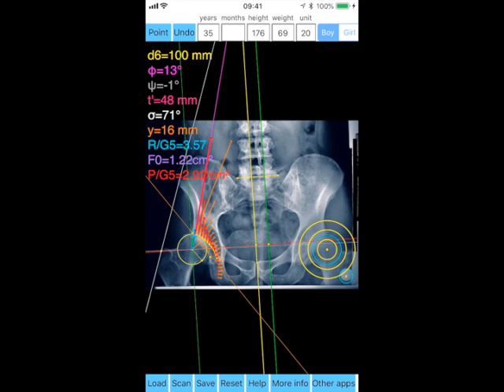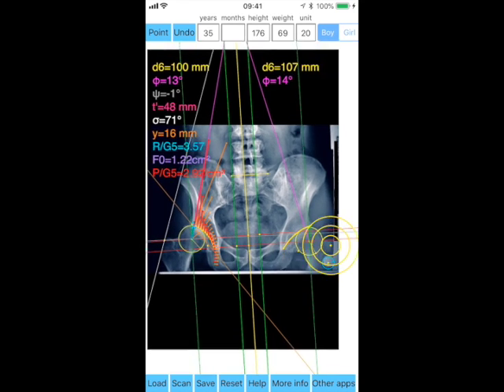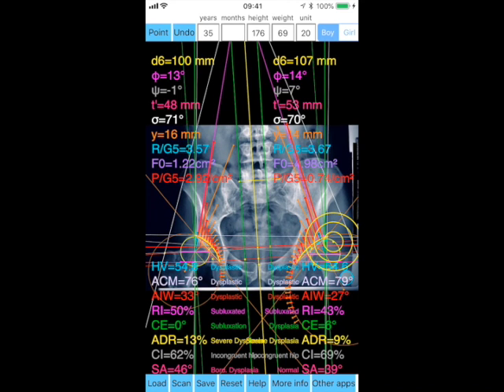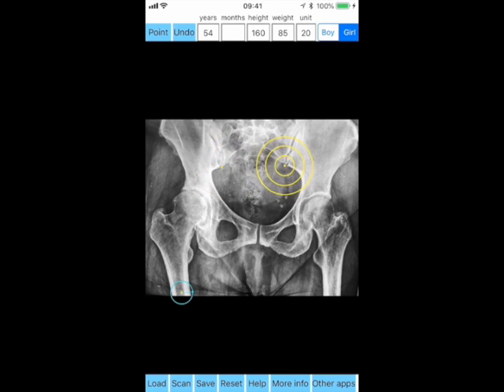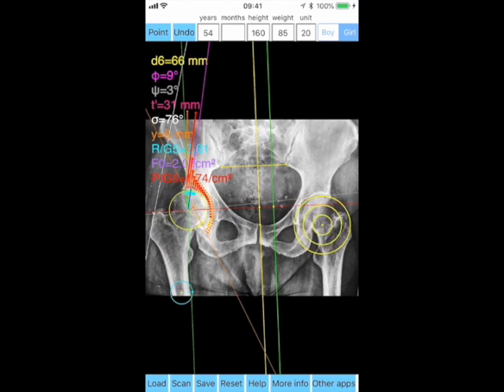The powerful undo feature gives the user the freedom to make corrections without resetting the whole procedure. Simply by clicking the undo button, the measurement returns to the last chosen point or state, and you are ready to choose the same point again, without resetting the whole measurement and starting again from the beginning. Moreover, the sides are independent, thus the user can measure first any side he wants.